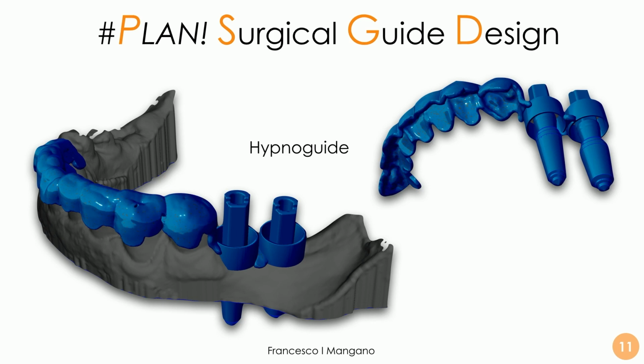We will insert later some polyether ketone sleeves before the surgery, and then what the surgeon receives is a set of 3 guides identical in the titanium part. The only difference is the hole within the polyether ketone milled sleeve. The nice thing is that you can use your own drill, your own surgical kit, because these guides are already conceived to be adapted to your drill, so you don't have to care about any stop or any reducer to insert during the surgery.